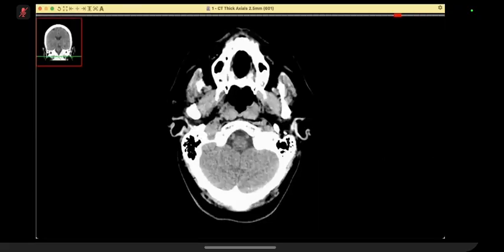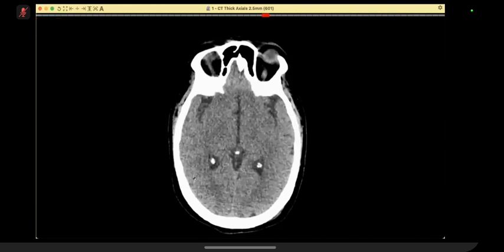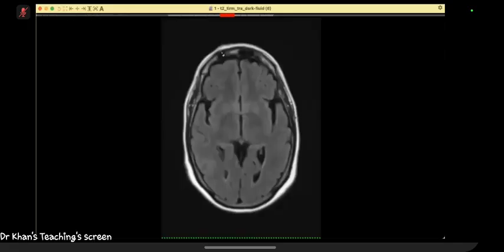I couldn't notice any other hematoma outside, so the differential may be intracerebral hematoma or contusion. However, there is no edema around, so it's not usual. So I would recommend MR with contrast for this case. So what are you suspicious for? I'm suspicious of hemorrhagic metastasis or underlying mass. However, the sinuses are okay. The superior sagittal sinus and the sigmoid sinus are patent. Okay, over to you.